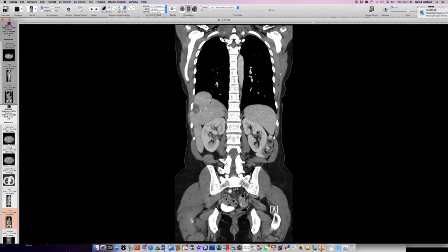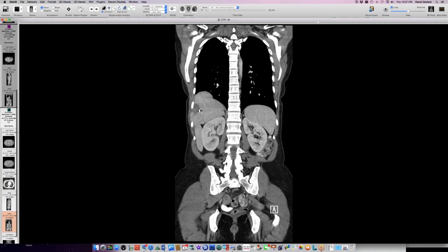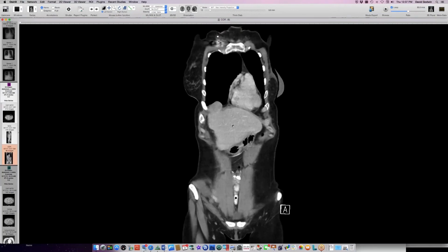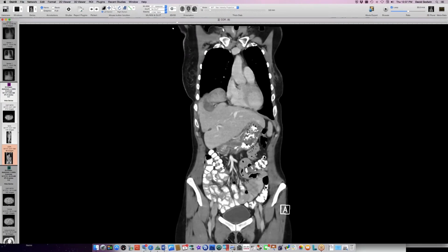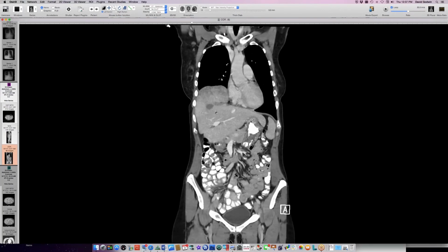And what we're having here is actually an effect on the diaphragm. So initially, after the procedure, the diaphragm had a normal contour. At this point, we have this little blip here that seems to have a separate arc from the rest of the diaphragm. And things got worse. So here is 9/17. This is 6 months later. And you can see that there's now a lot more liver that is herniated through a defect here that was caused by the procedures done for this hepatocellular carcinoma. So I don't know whether they heated it or cooled it or something, but they did damage the diaphragm, and there was at this point a hernia.